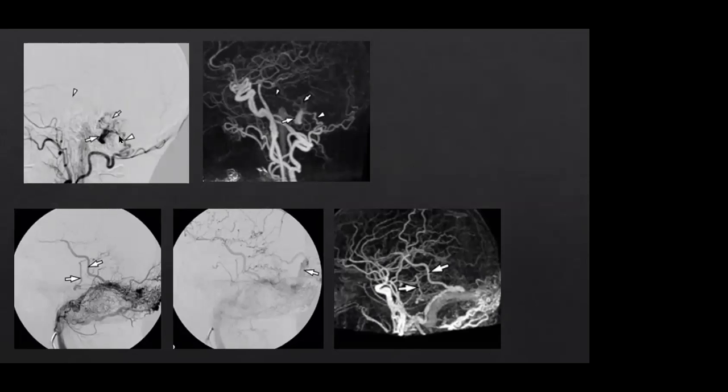No talk of sinus will be complete without talking about fistulas. I'm not going to dwell too much about the fistulas because I know you will have pathologies of fistulas and AVMs and treatment of them. But this is just to show you how imaging is quite essential in understanding the pathophysiology of disease.